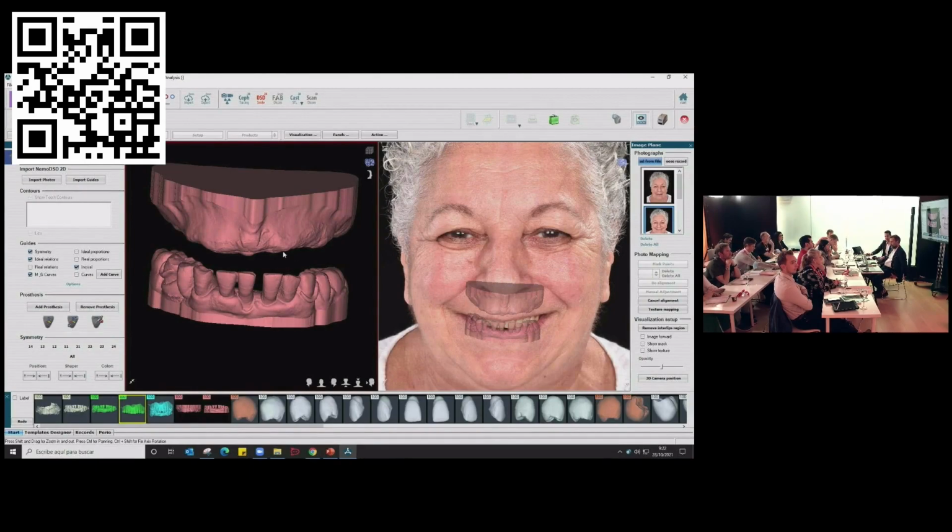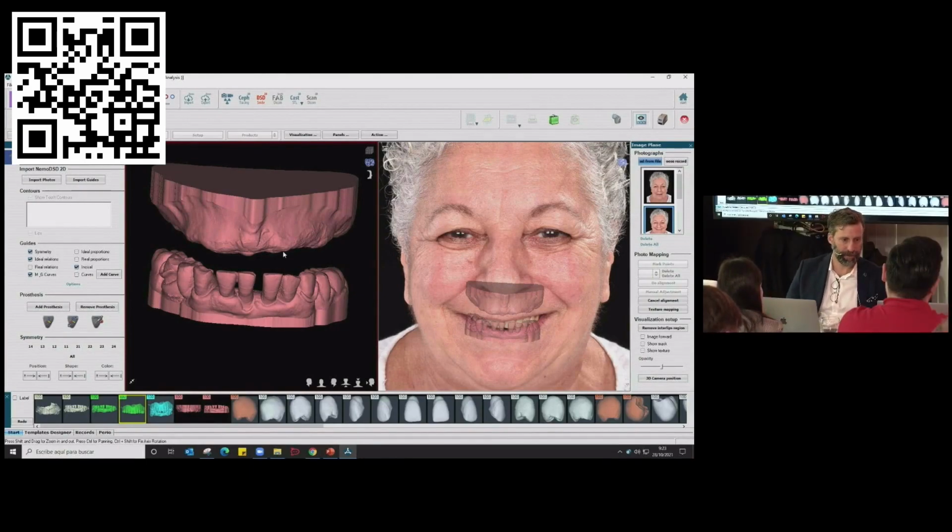So here we have Angelis, our dear patient that I'm gonna see in a couple of minutes. We can clearly see that, of course, she needs an upper full arch bridge, but she also needs a treatment on the lower, and we did plan that. We did design the lower. We're gonna see it, right? But for the course, we're only gonna be treating the upper arch, right?